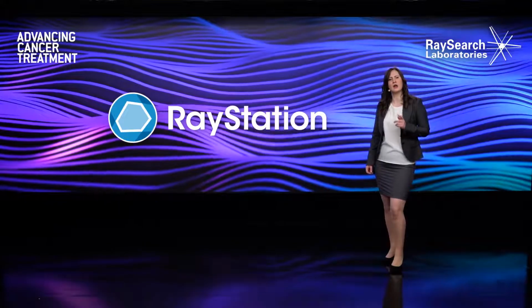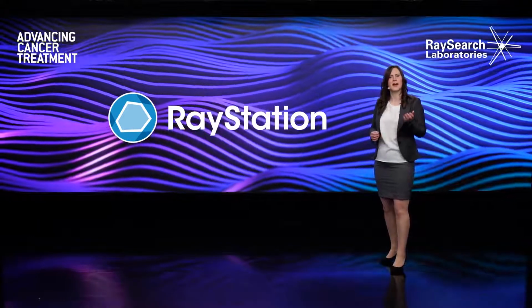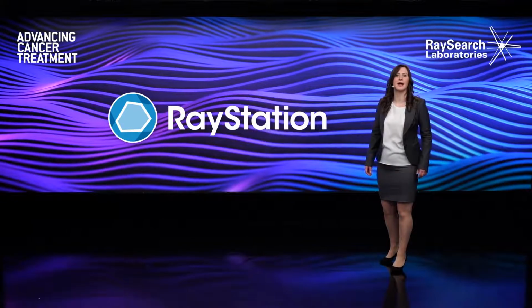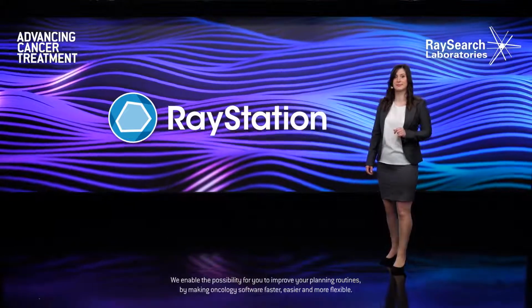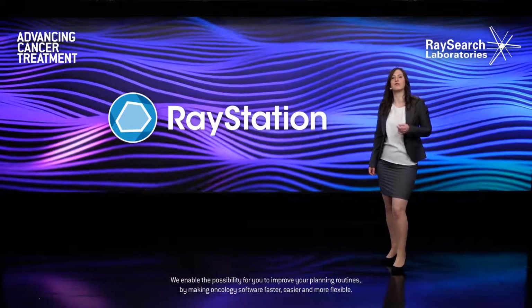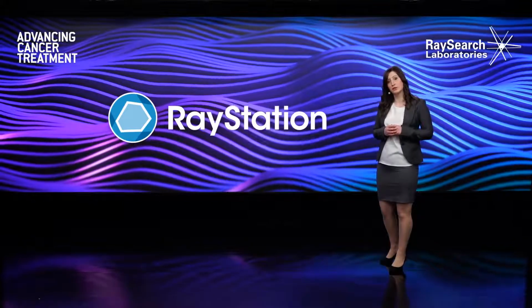At RaySearch, our goal is to advance cancer treatment through pioneering software for treatment planning. The speed and variety of treatment techniques like MCO, adaptive, fallback planning, and Plan Explorer make your planning routine faster, easier, and more flexible. In this demo, we will give you a general overview of different functionalities in RayStation. Now over to my colleague Julian Uzon, who will demo this for you.